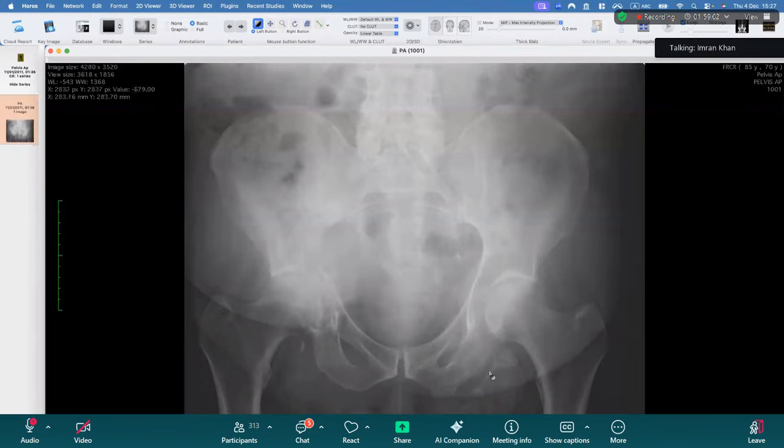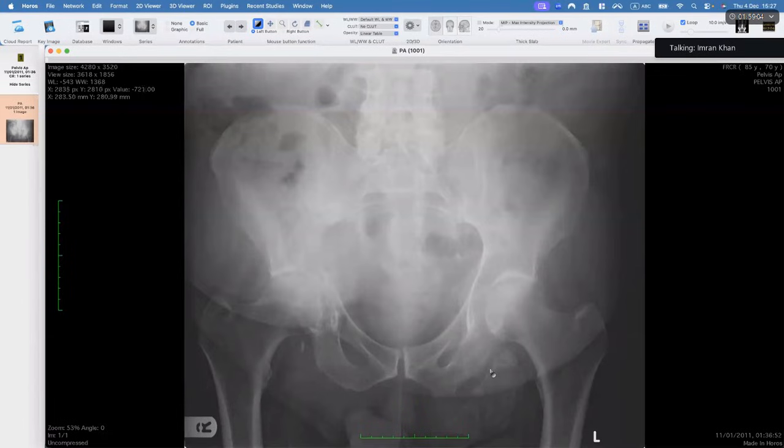Second thing was you mentioned displaced avulsion fracture. Okay, it can't be an avulsion fracture of the iliac bone if the iliac bone is still there, okay? Avulsion fracture means a bone fragment has sheared off. If there's a big giant bone fragment there, this is myositis ossificans, okay? You're not going to do anything about myositis ossificans. You're not going to do a CT. You're not going to do an MR. You're just going to tell the clinician, red herring, mate, myositis ossificans. If you want to take it out, take it out. If you think it's symptomatic, it doesn't need any further imaging, okay?